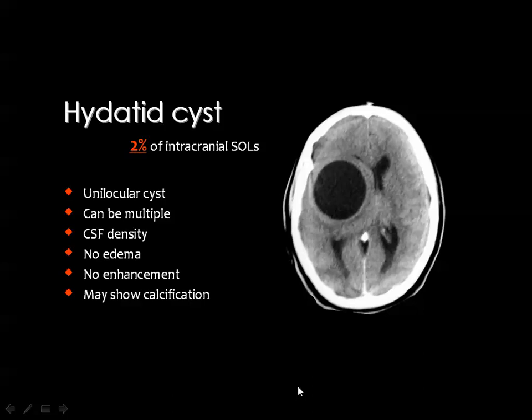Then one of the famous intra-axial cysts is the hydatid cyst, which represents 2% of intracranial space occupying lesions.